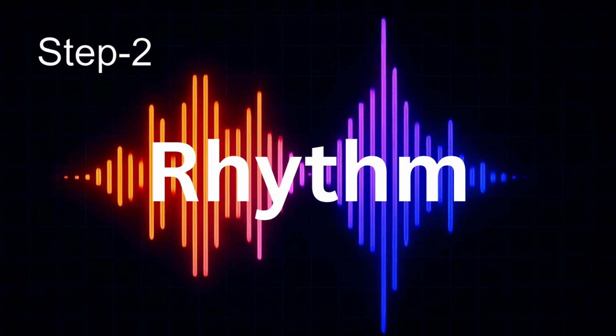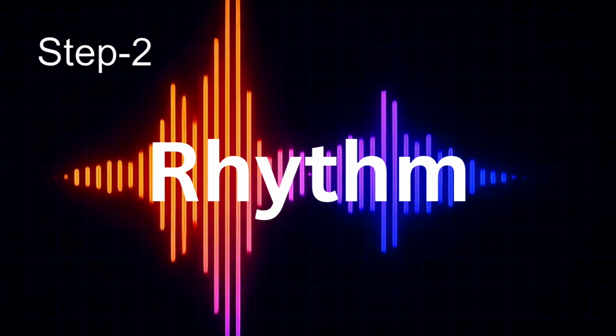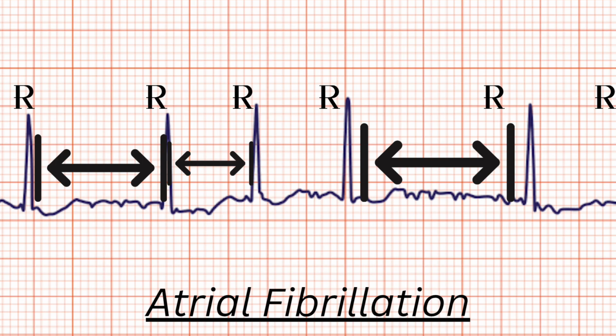Now step 2. How to know about the rhythm. Regular, or irregular, or irregularly regular. Let's find out. Next, check if the rhythm is regular. Look at the R to R interval. If the spacing is consistent, the rhythm is regular. If not, it's irregular, like in atrial fibrillation.